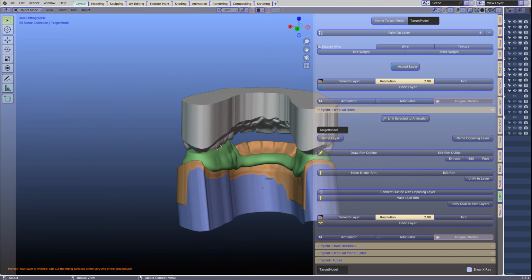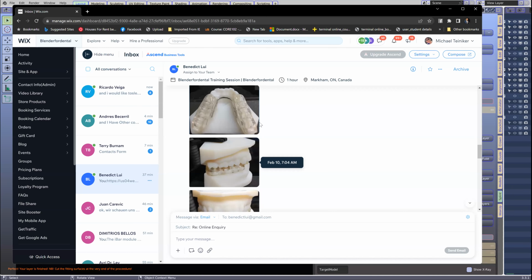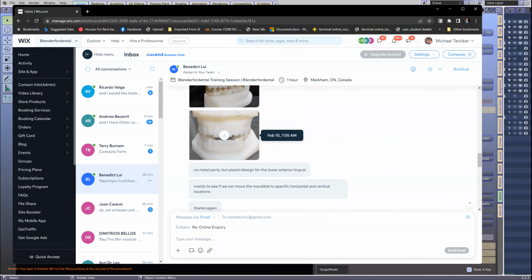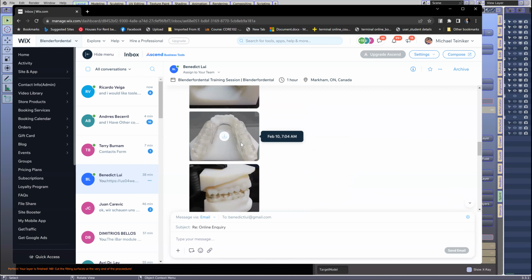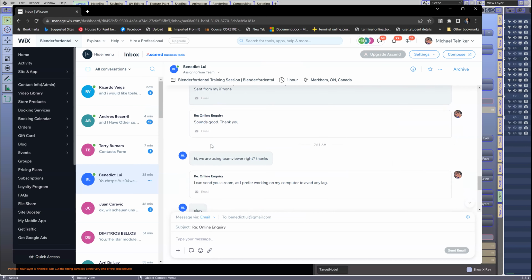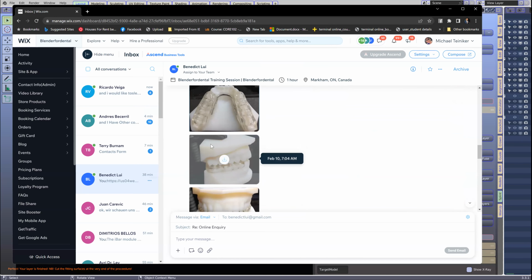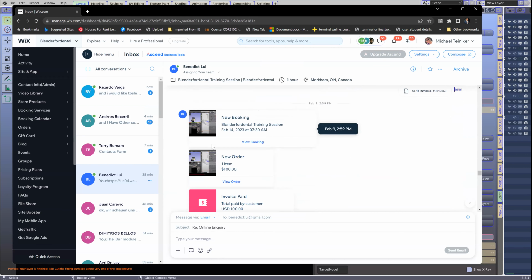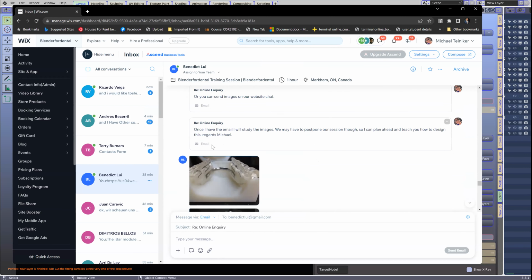Hold on a sec. No problem. Where's the wall? On the back, on the lingual. I think there's one more picture. Up, keep going, keep going. One more. Is it further down or no? Further up. Keep going, one more. That one, yeah, that's the one. I don't see it. Is it the first picture? Yep, first picture. Ah, I didn't even see that. Okay, you've got like a wall going up there. Yep. Okay, I see.